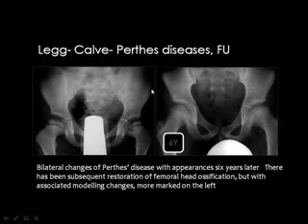Then what do you think about this case? This is a child 6 years old with Perthes disease of the left hip, and this is the follow-up X-ray after 6 years. This is the initial X-ray, and this is the follow-up X-ray after 6 years. Then you know that Perthes disease is reversible, and it can heal over a certain time, and you may get almost normal appearance of the epiphysis. There is minimal flattening, but the cortex is smooth. The metaphyseal irregularities have been resolved.